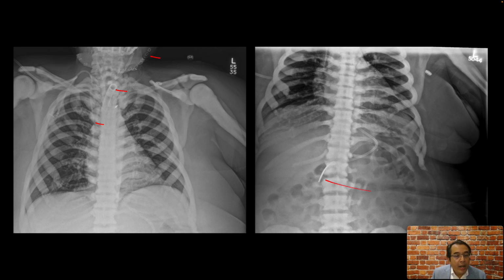But the incidental finding here is that the bones overall are hyperdense. And we see that finding on the chest, and we see that finding in the abdomen as well. So this is a patient with history of osteopetrosis, because of which they have hyperdense bones seen on the radiographs.